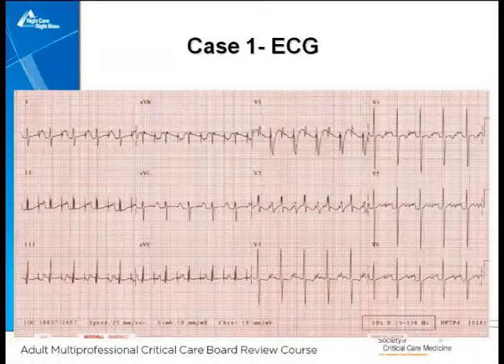We probably have to give about 15 or 20 seconds. You have to look at the tracing. It's not something they're going to be able to get first.